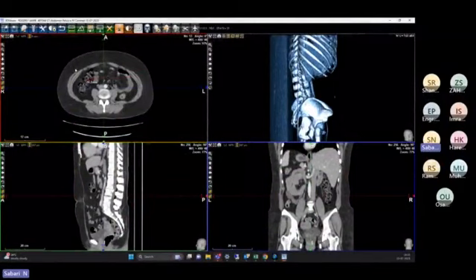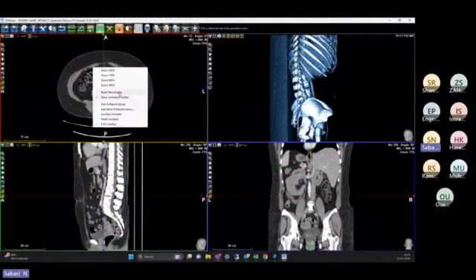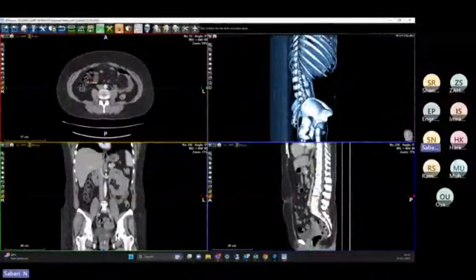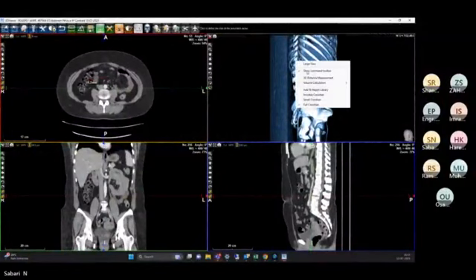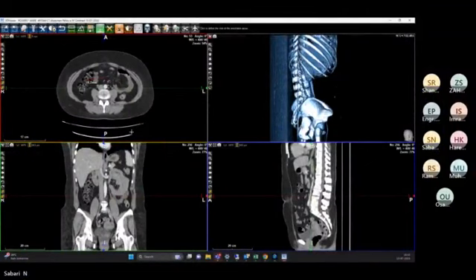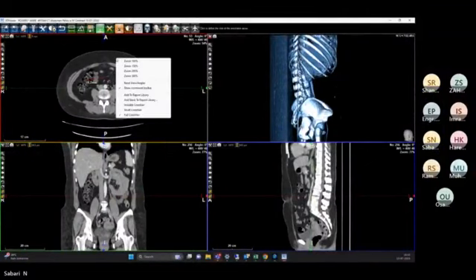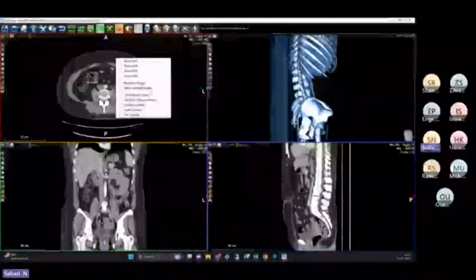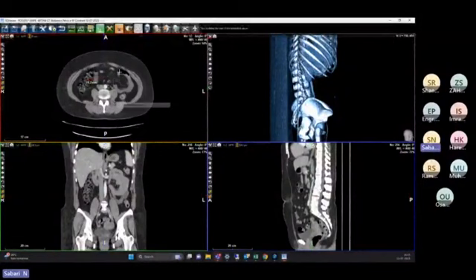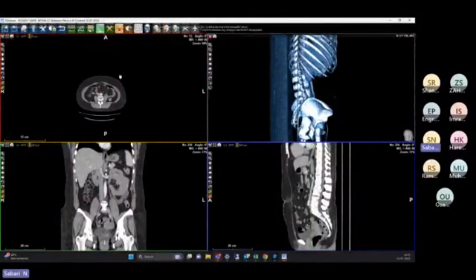Okay, so I just reset the things. Yeah. So 3D distance measurement. Reset is show command toolbar, art, invisible crosshairs. So we are also, one second.